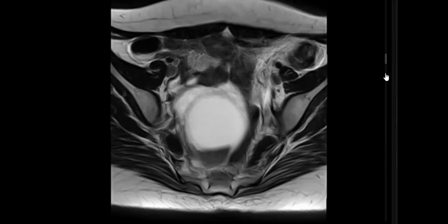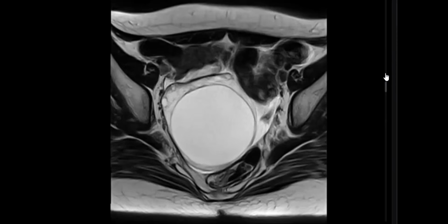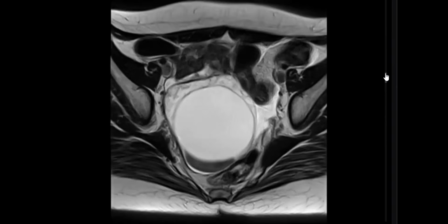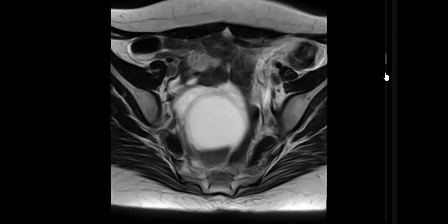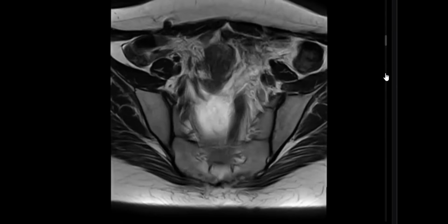What about the ovarian stroma, the residual ovarian stroma? I'm trying to look. It's wholly hyperintense and cystic in nature, with peripheral areas, not well formed follicles, and I can see some stroma and follicles at the periphery. Good. But the stroma is normal? No, it is a high signal, so it's edematous as compared to the other ovary or other sequences.